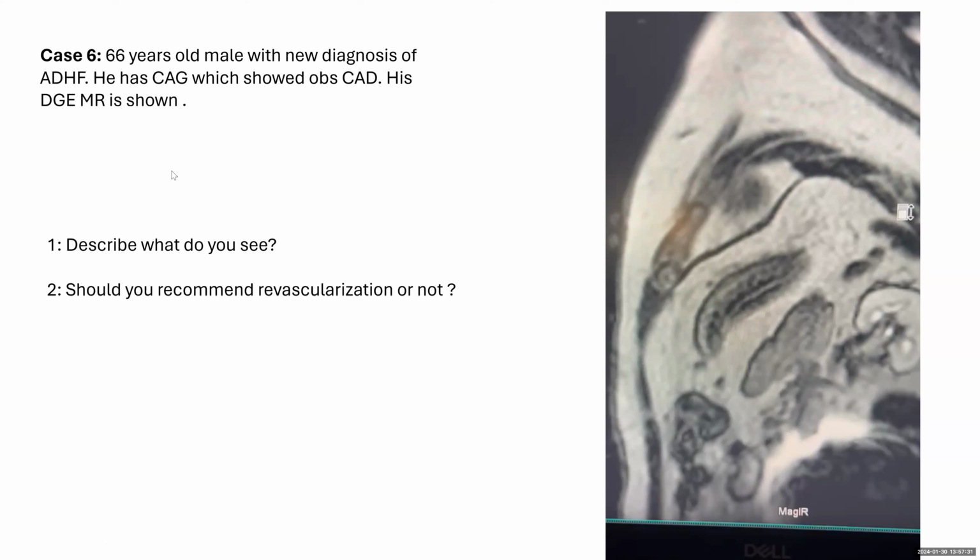Yeah, it's the first scar that actually involves the entire lateral and infralateral that is consistent with ischemia in the RCA/LCX, depending on the dominance. The second is consistent with ischemia in mid-to-distal LAD. So, given all this information, without even looking at the coronary angiography, and you sit in the heart team meeting, should you recommend revascularization or not?